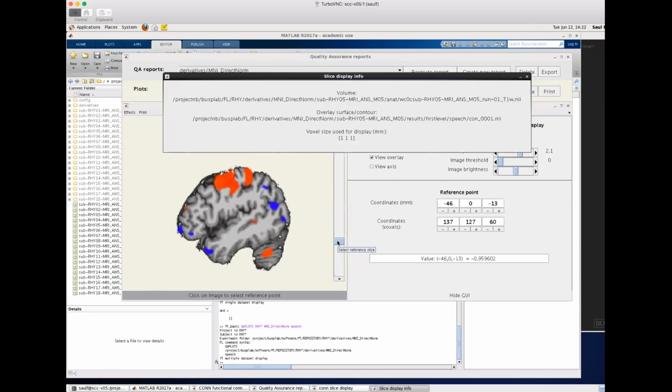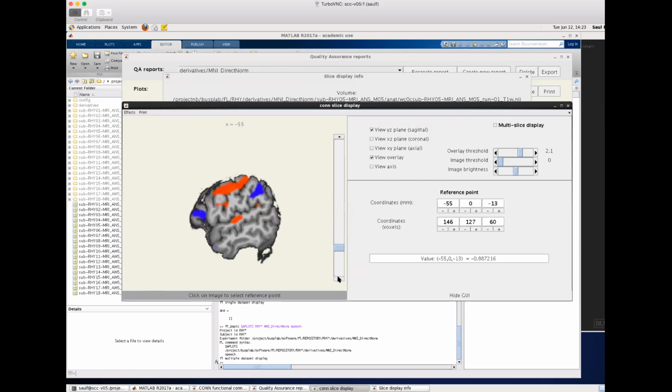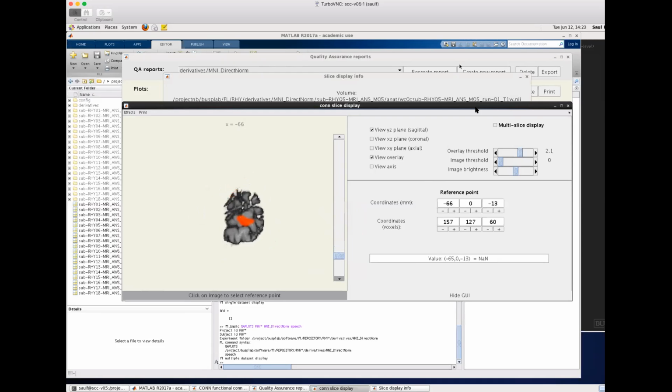Let me remind myself how these are generated. I think they represent contrast, but I'm not totally sure. Let me just double check. So yes, those are contrast values. They come from SPM, XCon, VCon. So that should be just contrast values.